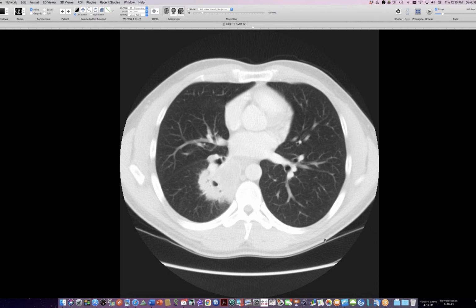And squamous dedifferentiation is one of the things you worry about in respiratory papillomatosis. Okay, so the respiratory papillomatosis with a big squamous cancer. This was treated with bilobectomy and resection of middle and lower lobes. You can see the involvement crossing the fissure here into the middle lobe.